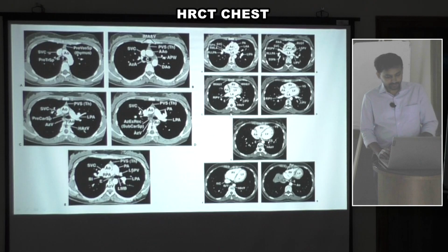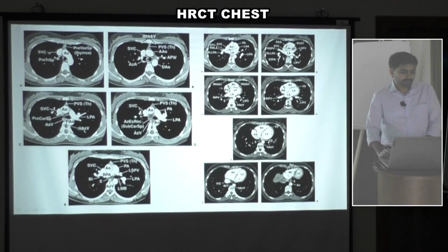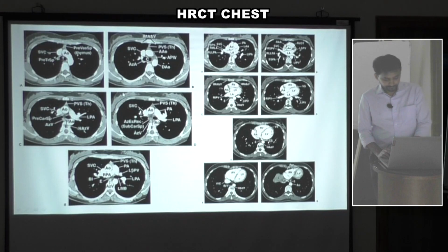So this is the normal mediastinal window, showing vascular structures, and here the precarinal space, the prevascular space, the aortopulmonary window. If you have any malignancy cases, or any suspicion of mediastinal masses, always look for mediastinal node enlargement. These spaces especially will show the enlarged lymph nodes.